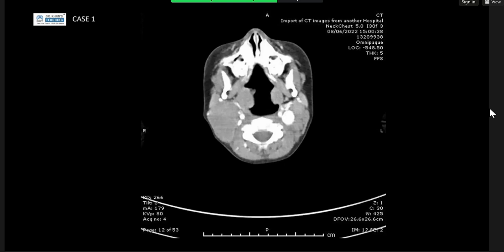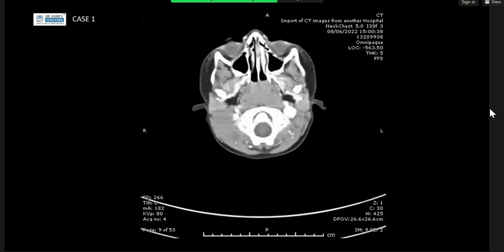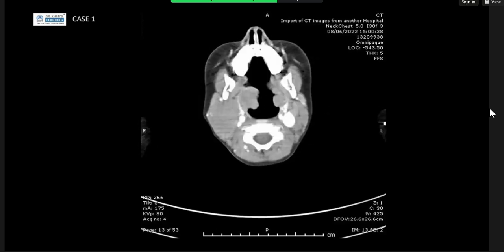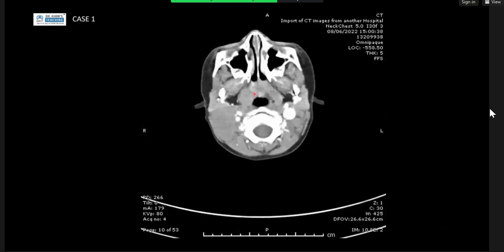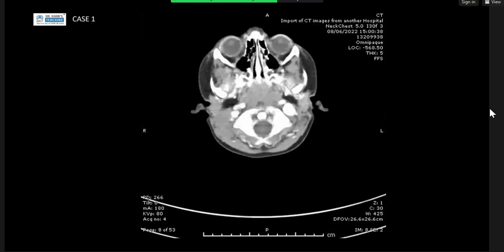Okay. All right. So, the ones that you mentioned are often a bit more vascular, which is why we didn't think this was a glomus tumor or one of those paragangliomas, because the glomus tumors really tend to be a bit more vascular. So this one seemed quite homogeneous, in the region of head and neck. Okay, so you say it's splaying. I'm not that convinced it's splayed, more that there's mass effect. It's not in between the vessels, the carotid vessels. And because it's a head and neck region, we see a mass there. Okay, let's see what the diagnosis is. I think so. Looking at it.